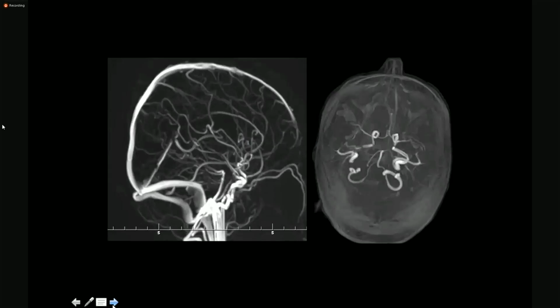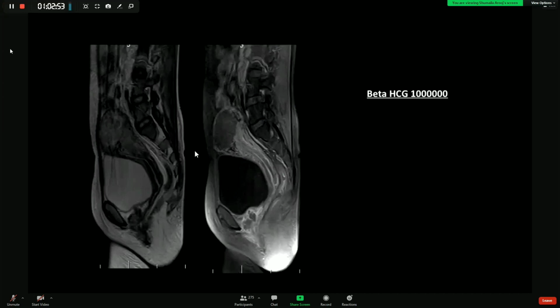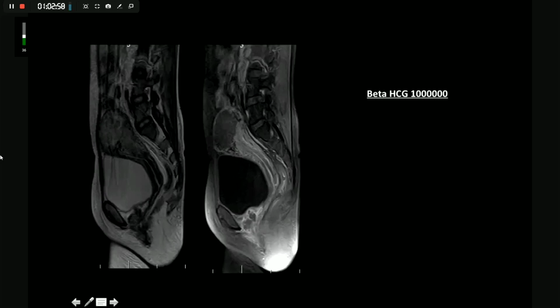MRV भी ठीक है, MRA भी ठीक है, आपने जो डाउट दिया इसका. पेशेंट का beta hCG जो था वो 1 मिलियन था, 1 मिलियन यूनिट्स, ठीक है. और ये पेशेंट के mets थे from a choriocarcinoma, ठीक है. ये इसका पेल्विस का MR है. So she had a history of pregnancy, she had extensively raised beta hCG levels. उसको 3rd ट्राइमेस्टर में भी शदीद वॉमिटिंग्स थी. जब हमने उसका beta hCG लेवल कराया बहुत ज्यादा था, अल्ट्रासाउंड किया उसमें भी मैस आ रहा था. We needed actually MR pelvis तो चाहिए था हमें, क्योंकि हमने स्टेजिंग इसकी बेसिस पे करनी होती है.